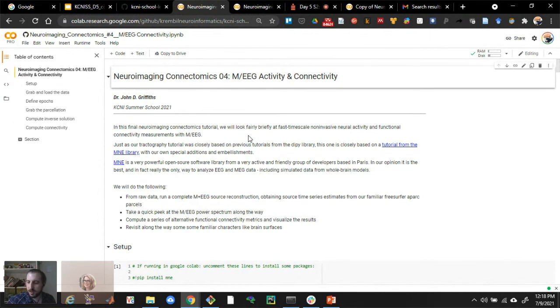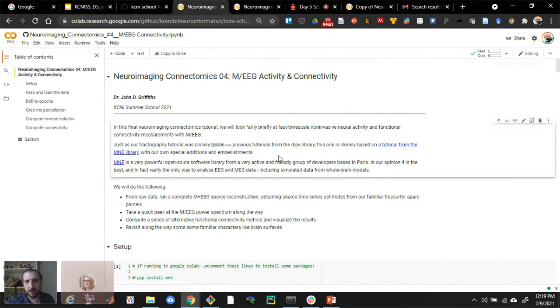What we're going to do here is, again, go through a tutorial. I'm going to give some comments, and make some nods to the methodologies and some of the elements that we've looked at previously, the connectivity matrices, parcellations, etc. The tutorial that I put together here, again, is based on another tutorial, and I'm not claiming authorship of any of these things in a fundamental sense, and why would I bother doing that?